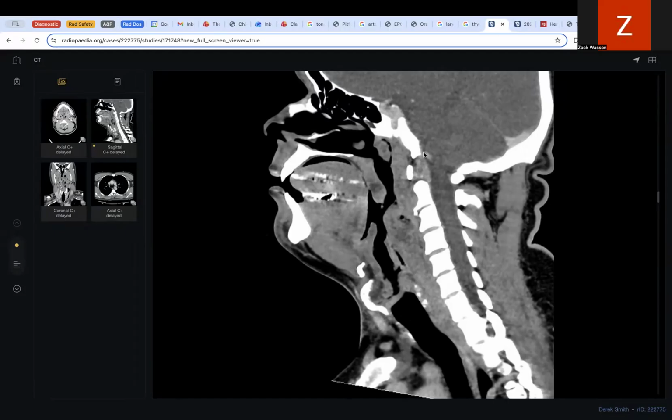I'm going to be taking us through some of the different views of a CT head and neck exam and pointing out some of the anatomy that we can see there, and then comparing that to an X-ray image, and then a couple of MRI images as well, and explaining the difference between those and what can be seen and what can't be seen, and what is better for different anatomical structures. So we're going to start here with the reconstructed CT.